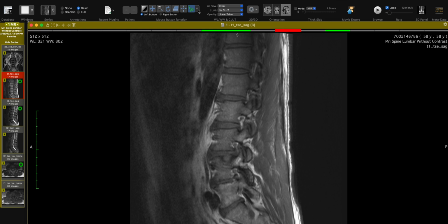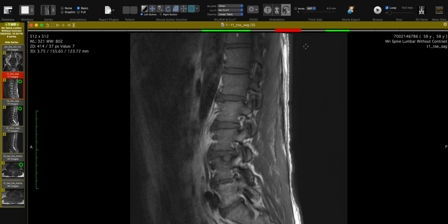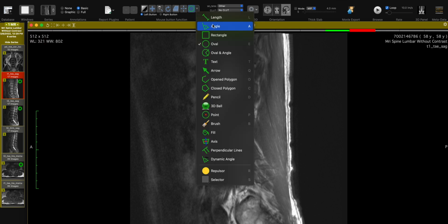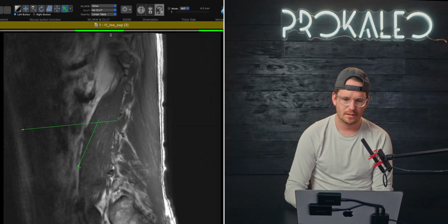There's a little bit of irritation in that area. That facet joint, a little bit in that foramina, I'm guessing. So that's L4, L5, L3, L4 as well. Just for your knowledge, this is a hip flexor called your psoas. So you see how that muscle can pull it forward. If that muscle's really tight, it's going to pull it in that direction because the muscle runs in this direction. So it's going to pull you into more of that arched posture, which is classic in stenosis.